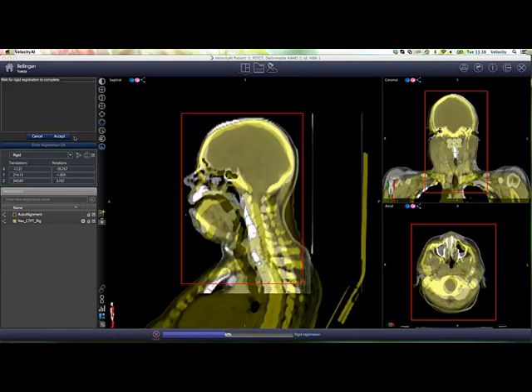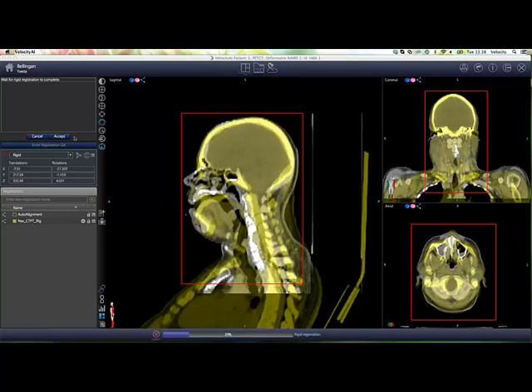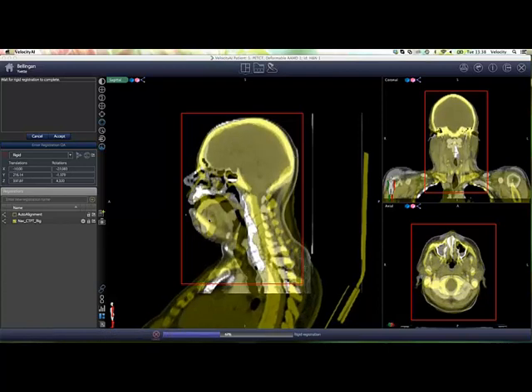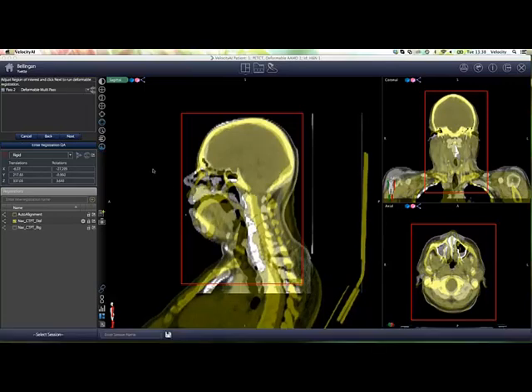What I do is I'm going to select the deformable multipass, and what it does, it runs the registration across 3 resolution grids. So it does a coarse resolution, a medium resolution, fine resolution. All right, and if I'm not satisfied with that, I can make my region of interest a little bit smaller and rerun the registration. Now this is completed, and if you have a look here, it has changed the PET registry onto the planning CT. So we now have the diagnostic PET registration that is chained onto my planning CT.